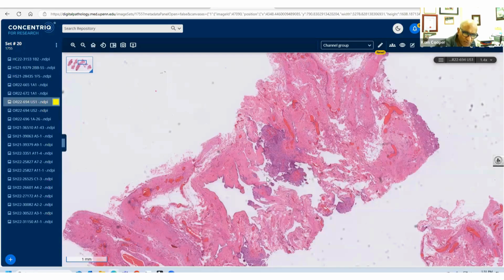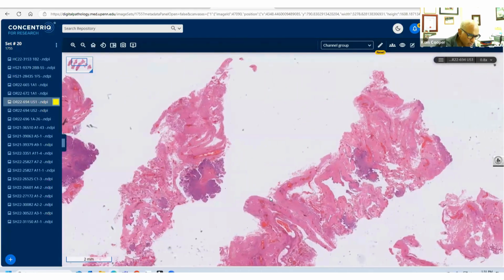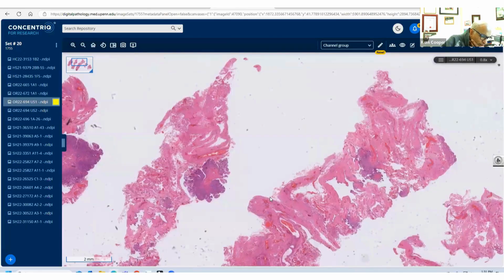And we found that paper useful, and that's what we called it. We called it a well-differentiated papillary mesothelioma with microscopic invasion. Remember, Carla, the well-differentiated papillary mesothelial tumor does not have invasion, right? Does not have. This had invasion, and this was multifocal, and this is in the paratesticular areas as well.